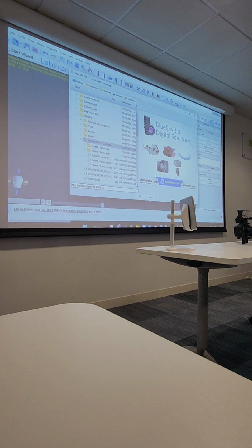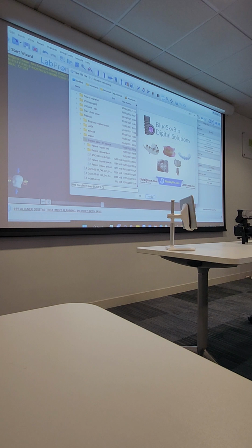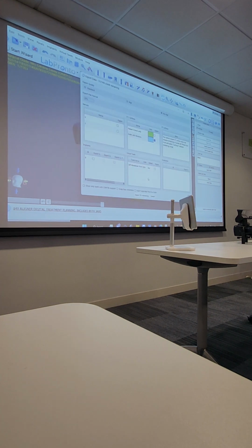This is where it's going to ask you where to export it to. And this is where you start to pay money. Do you see I've got 51 remaining exports here? It's going to take one export fee off you. That's the only time you pay, £18-20, whether you've got one implant or 10 implants on the guide.